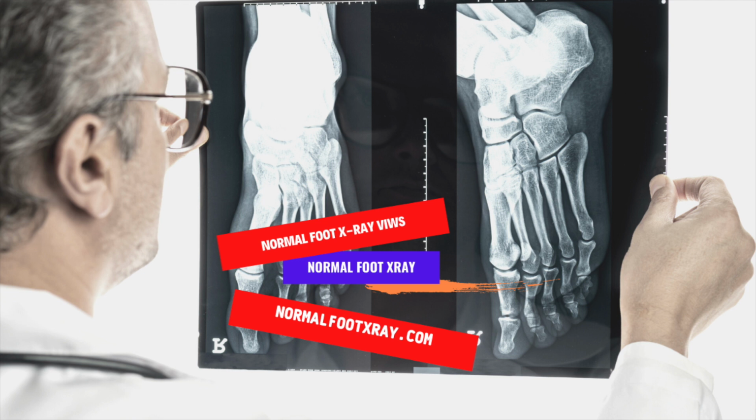There are many differences between the two views. A good quality X-ray is essential to a correct diagnosis. However, when the image is poor or has too much detail, it may be time to change your technique. A normal foot X-ray should have all of the bones visible.